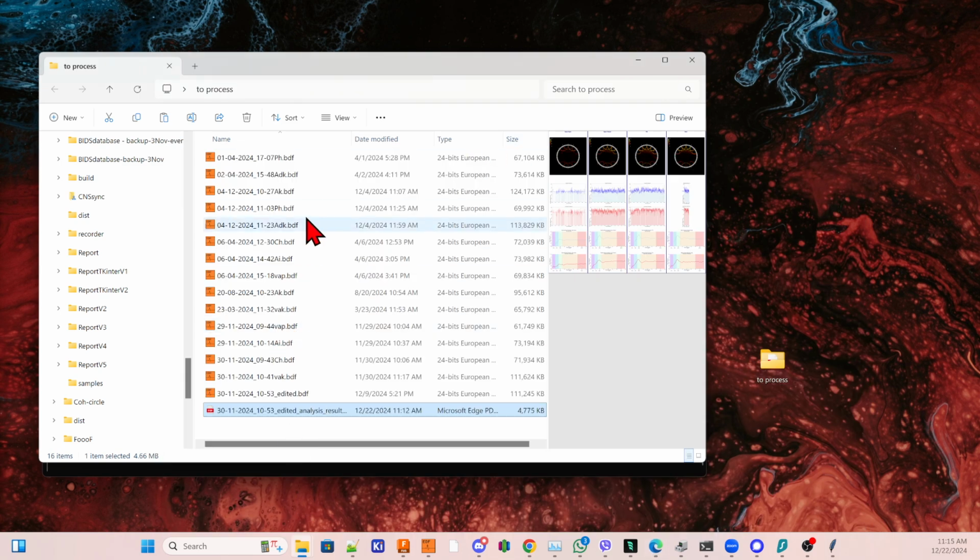All right, now I have a whole bunch of recordings over here, and we're going to do them. Let's see how far we get. I've changed the names so that only I know who is who.